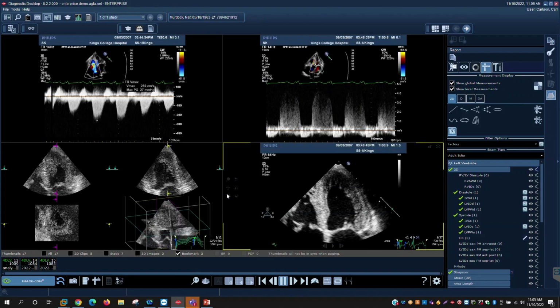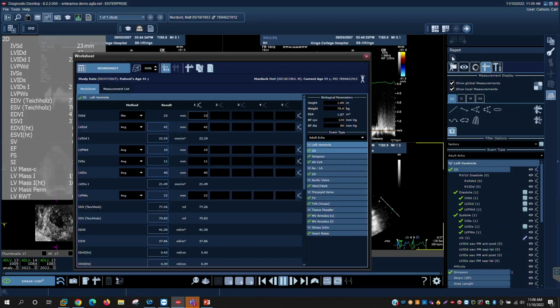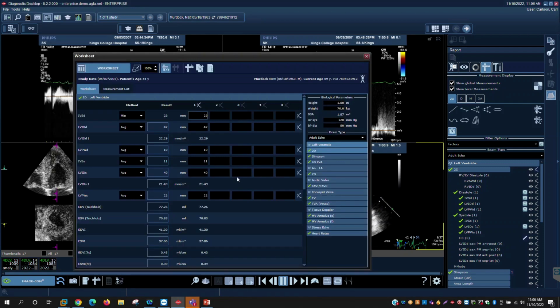One of the biggest advantages of our application in our imaging area for cardio studies is the fact that we are a vendor-neutral system, and we do allow an extension of your ultrasound machine, for lack of better words. So you'll notice here that you'll have a complete measurement suite, so that in the event you wanted to modify or take additional measurements that the sonographer didn't perform on the machine itself, you have the ability to do that here. Now, of course, it's customary for the sonographers to always take measurements intra-procedure, and those measurements will come over and populate into what we call the measurement worksheet.